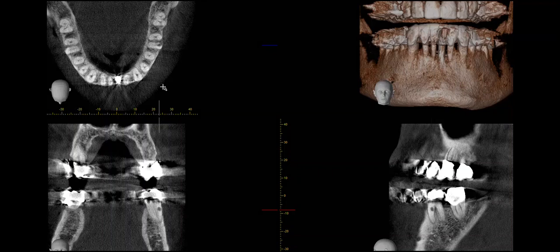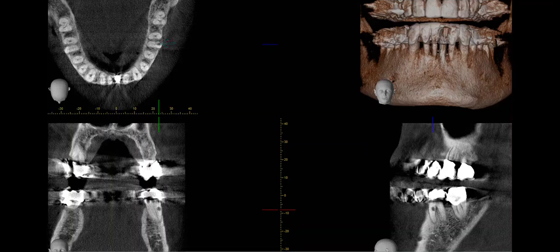This is the CBCT for this patient. Let's look at the different views so we can get a better idea of the extent of the resorption. I always start by reviewing the axial image first, because this gives me a lot of good information without having to manipulate the scan very much. Here we can see the resorption has entered the mesiobuccal canal. Therefore, endodontic therapy is necessary.